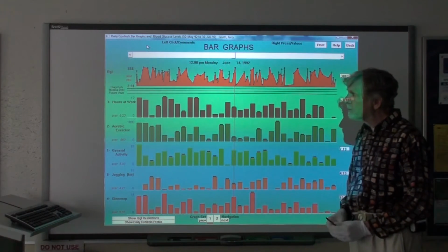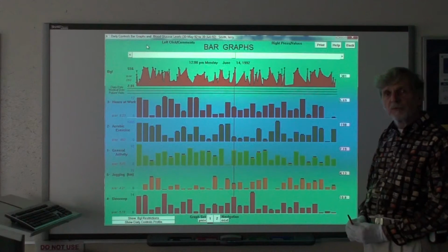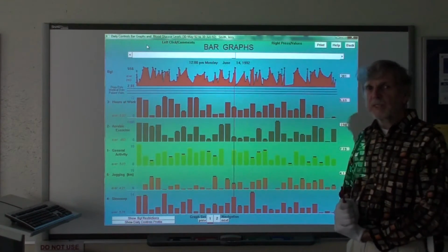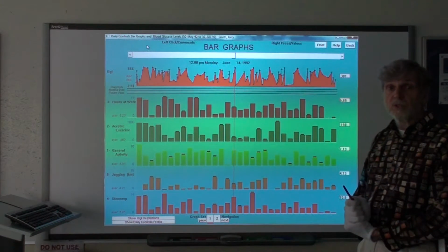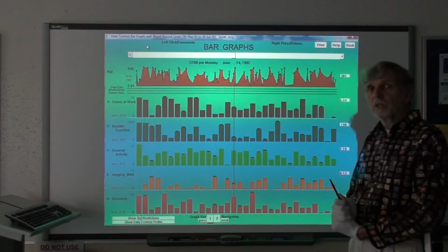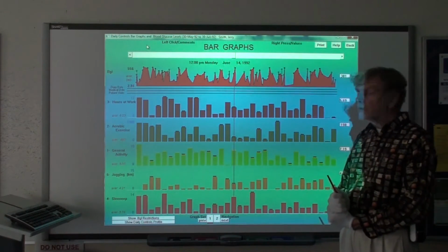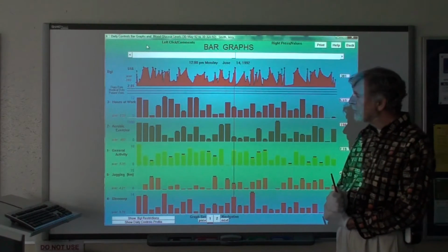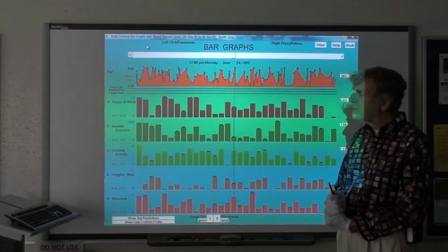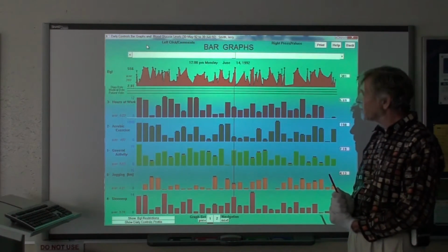Under it would be some selected activities that you're interested in monitoring for him. For example, you might want to monitor the number of hours that he's sleeping each night. You might want to monitor his total caloric intake, or the total amount of each medication, NPH or regular insulin or metformin, that he took during the day. You also might want to monitor any other specified item that you have asked him to keep track of, following your hunch that it might be influencing his blood glucose levels.